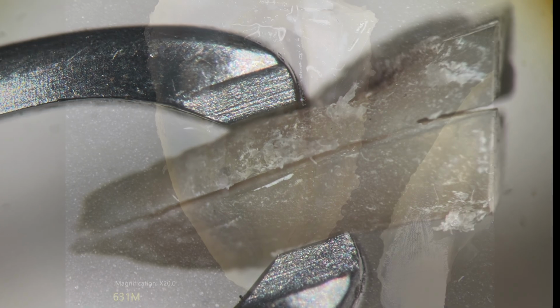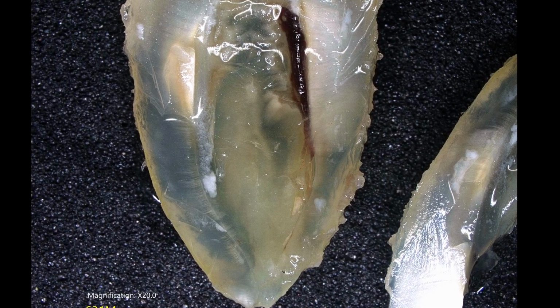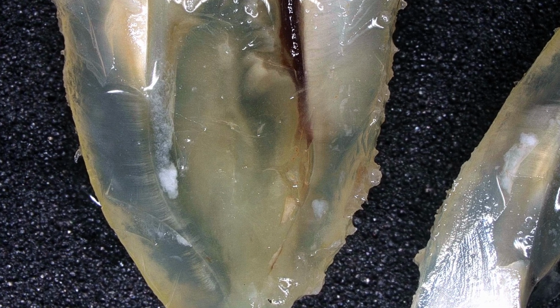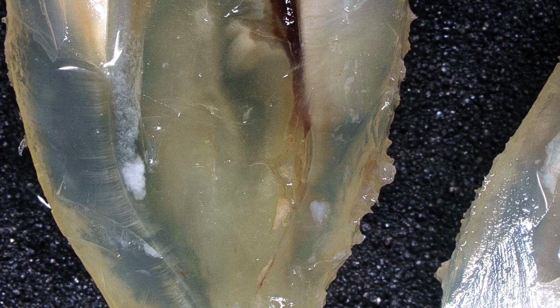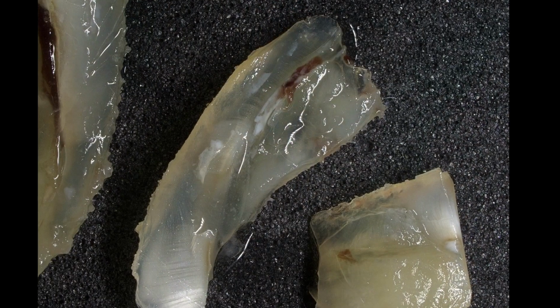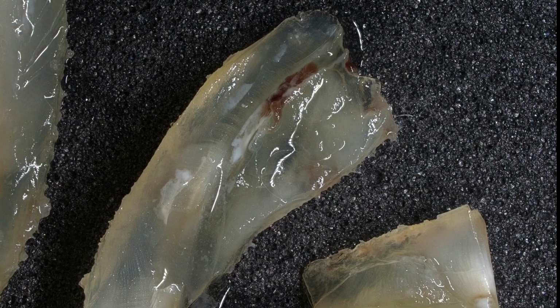According to our method, we sagittally split all the roots. This is the mesial root. So you can see in the mesiolingual canal, looks like there was still quite a bit of pulp tissue. And the mesiobuccal canal looked very, very clean. The debris you see on the mesial canal is from the sectioning.